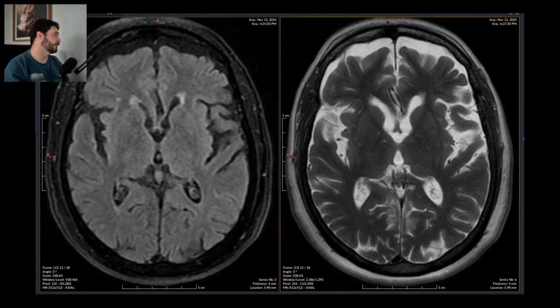This is a very common exam. This is a Fazekas 1 gliosis plus a mild reduction in brain volume. So I have this. Just going to add the hippocampus phrase right there. It's MTA 2.